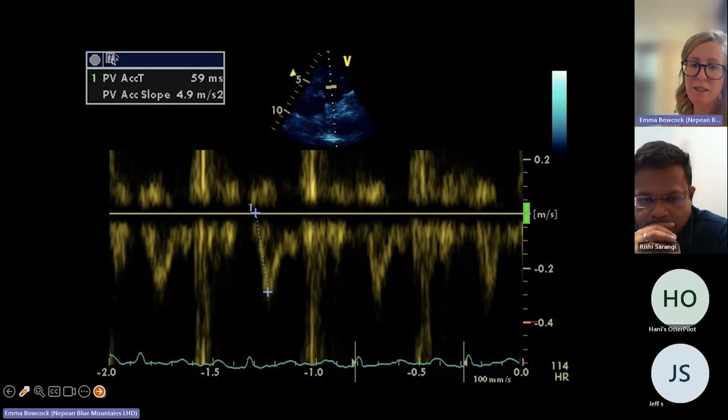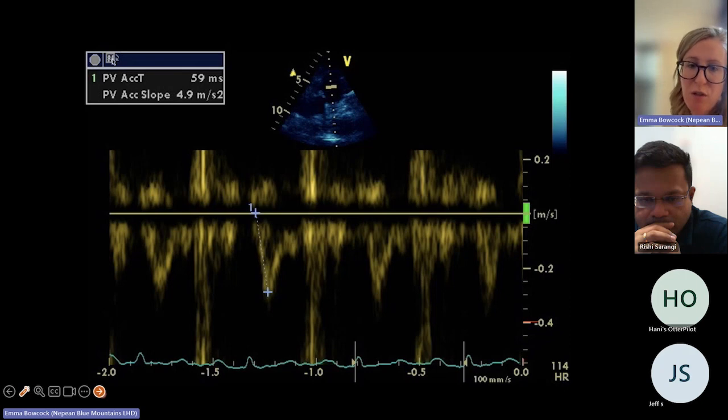Yeah. How about this tracing? What is it? And how could you have optimized it a little bit as well? These are the sort of things that they'll ask you in the DDU. Sure. Don't think I'll be doing that one in Australia, but okay. Okay. Fair enough. But so, too fuzzy for sure. So need to clean that up a bit.